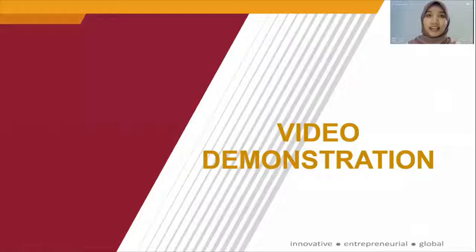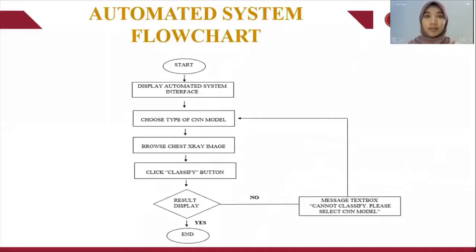As promised, I will demonstrate how this project works in this video demonstration. Before that, let me explain this automated system flowchart. It will start by displaying the automated system interface, which is the GUI, graphical user interface.